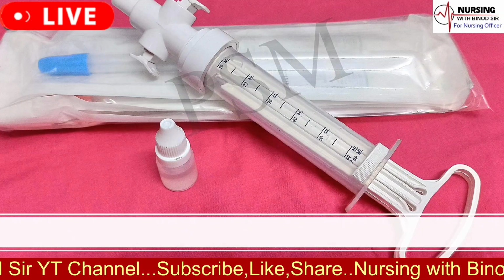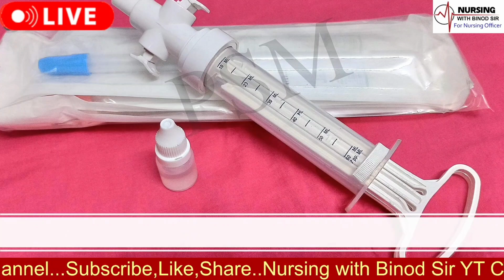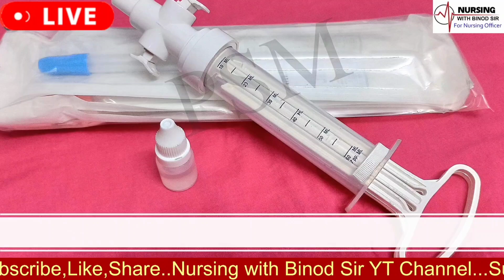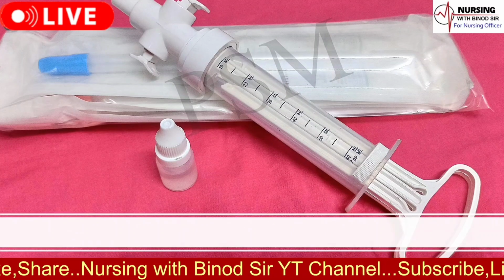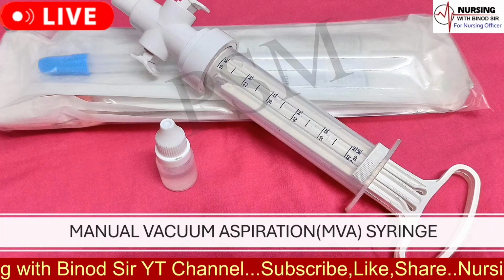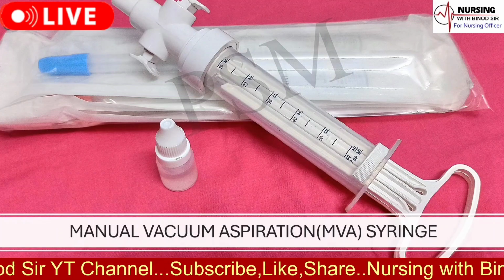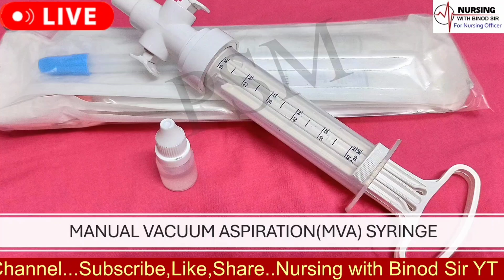1. Incomplete abortion management, MVA is used to evacuate the uterine contents in the case of an incomplete abortion before 13 weeks of gestation. 2. Molar pregnancy management, it's used to remove abnormal tissues associated with molar pregnancies. 3. First trimester abortion, MVA is employed for terminating a pregnancy in the first trimester.